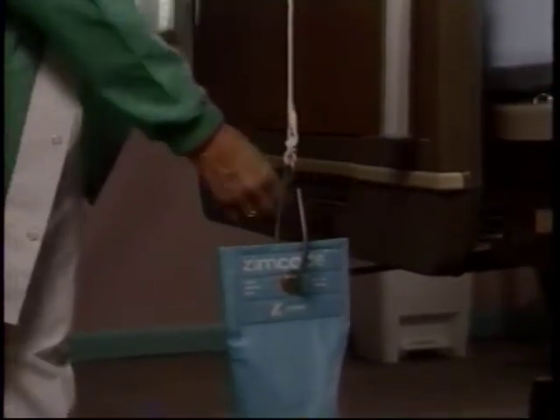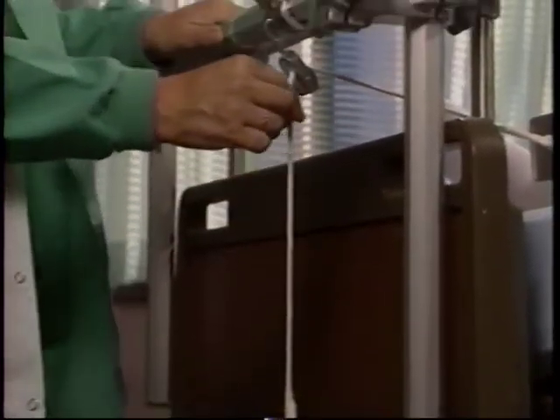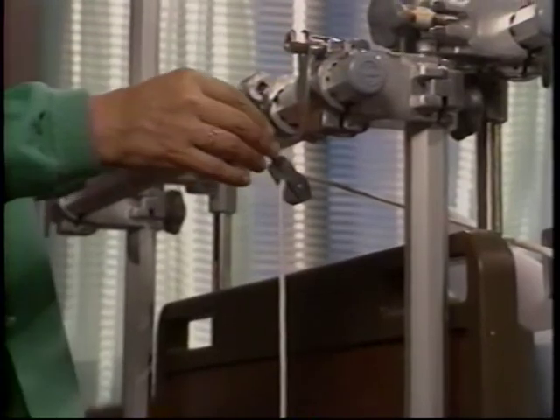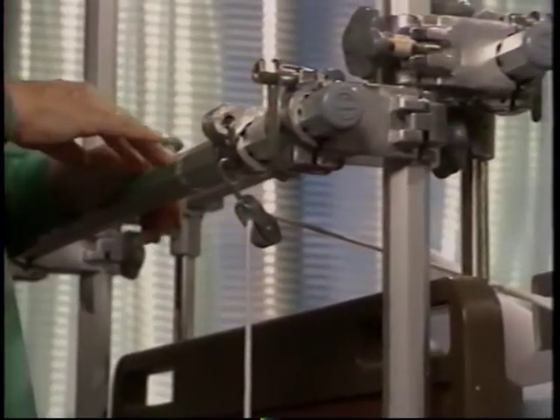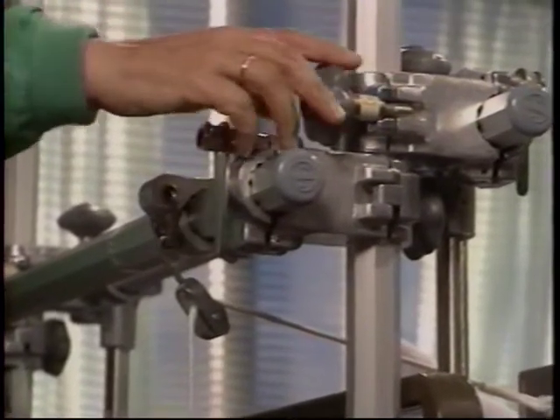Check that knots are clear of the pulleys and that there are no clamps or hooks resting against the bed frame. Check frequently to see that the pulleys are working properly and that ropes run in the middle of the pulleys. Inspect all frame bolts for tightness.